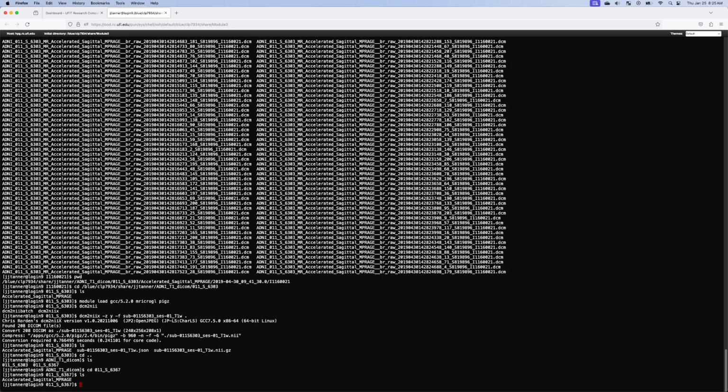Now, shortcut, push the up arrow key on your keyboard, and you can go back to get previous commands. There's other commands. You could type a history command, history, and that will print commands you've run. I won't do that, but you can use the up and down keys to get your different commands.